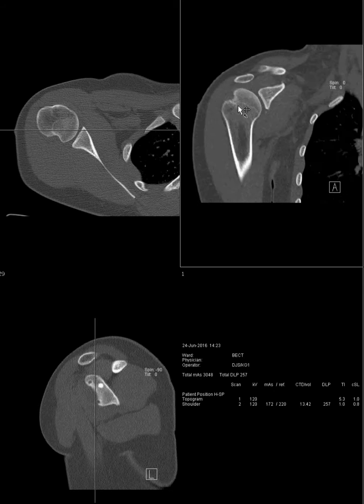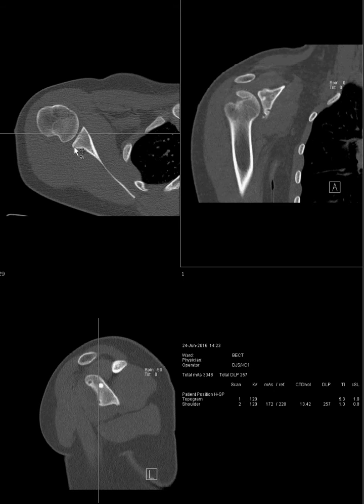And the way you correct this, and the way you're supposed to be doing this, is using the axial images to prescribe your other planes. You draw lines that are either parallel to the glenoid surface, which results in something that resembles a sagittal image of the shoulder, or something that's perpendicular to the glenoid surface, and that will result in a coronal oblique image that's actually like coronal to the shoulder. And that's what we're looking for when we do these studies.